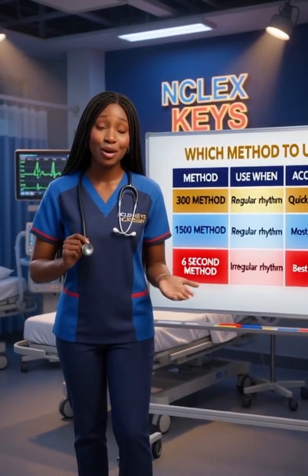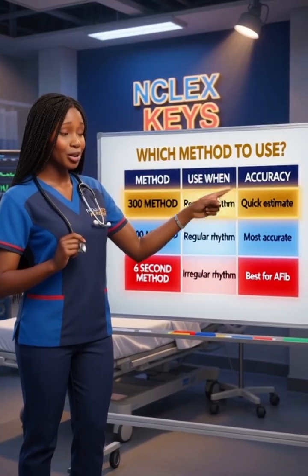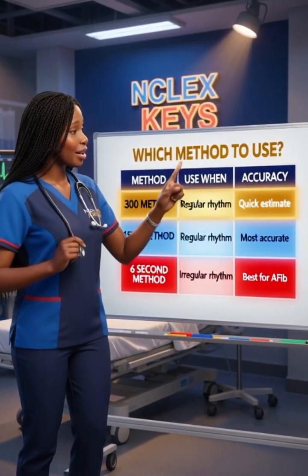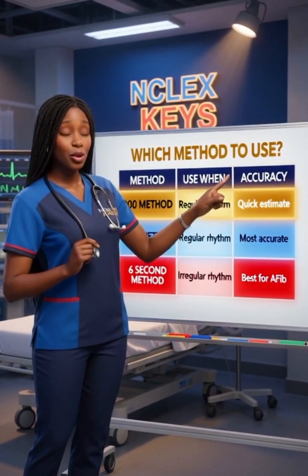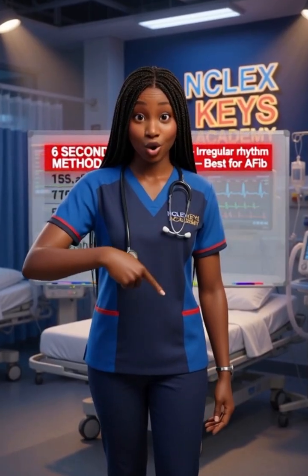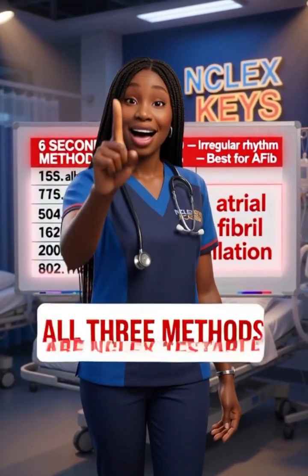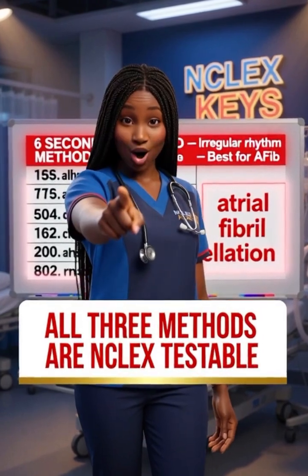Here is a quick summary of when to use each method. Use the 300 method for regular rhythms when you need a quick estimate. Use the 1500 method for regular rhythms when you need more accuracy. Use the 6-second method for irregular rhythms like atrial fibrillation and atrial flutter. Know all 3 methods for your NCLEX exam. They are all testable and important.